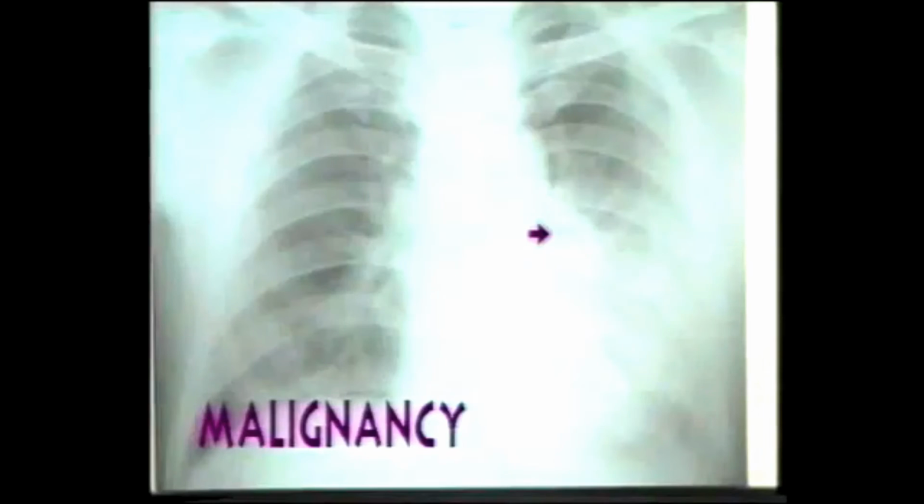And number 2, if resolution is partial, there may be an underlying bronchogenic carcinoma with partial obstruction of the proximal bronchus. Note this dense hilar opacity in this partially resolved left lower lobe consolidation. Particularly, if there is a collapse associated with consolidation, bronchoscopy must be done to rule out bronchogenic carcinoma. Note again the uniform opacity of the lower lobe and dense opacity at the hilum.